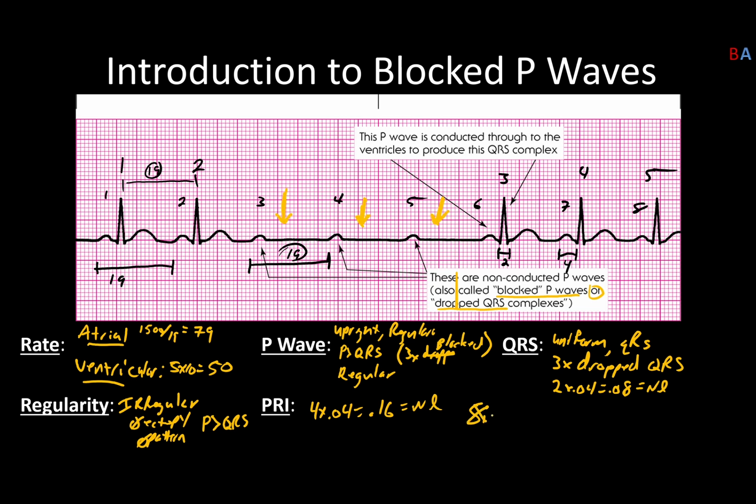Actually, what we truly call it, we don't even need the sinus bradycardia, sinus tachycardia, any of that. That's kind of assumed in there that this is going to be slow, particularly when you have a block along this line. Really, all we need to say is that we have a second degree type 2. And that's all it takes.